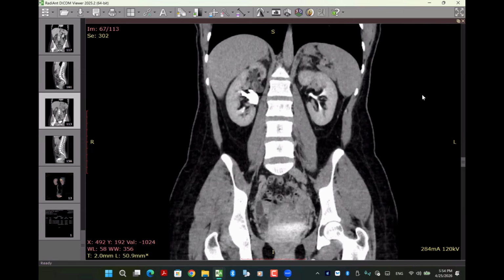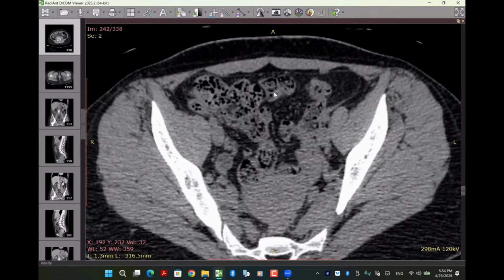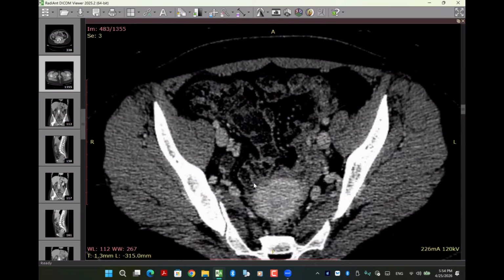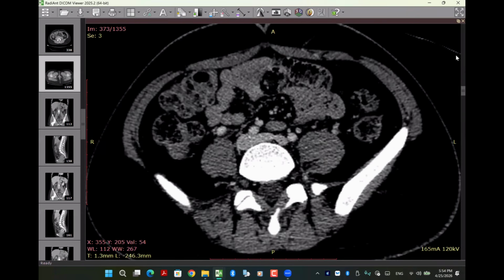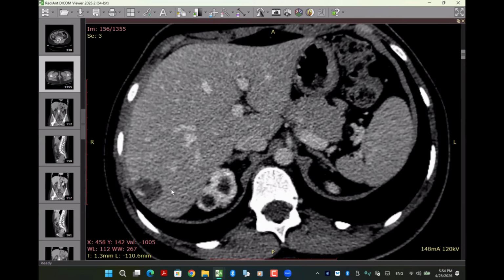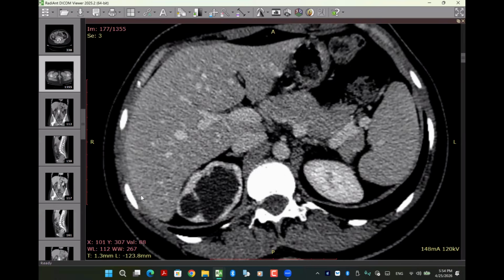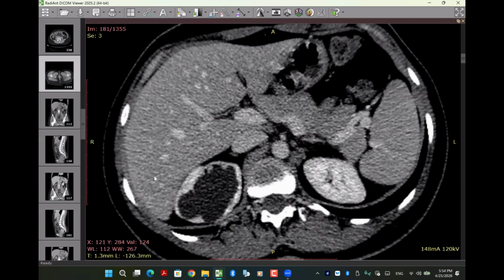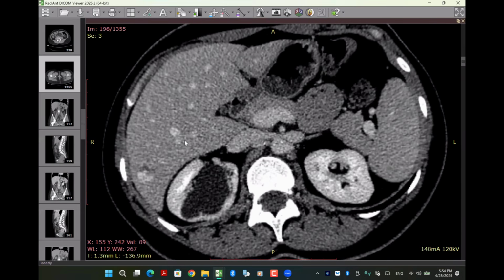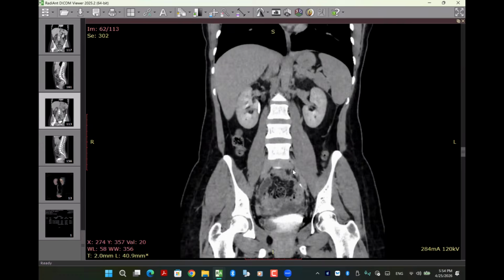Okay? Yeah. You did very well. What about the lesions that you accidentally discovered inside the liver? Can you comment? These are, I think, simple cysts, or could represent hemangiomas, because there's pooling of the contrast seen at the periphery. So these may represent hemangioma. Nice. Can I confirm the possibility of hemangioma in this? Yeah, because there is peripheral pooling of the contrast, we can see the delayed image.